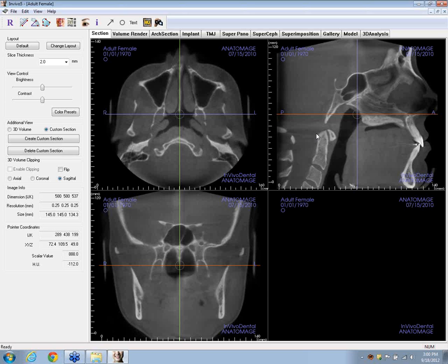Today we're going to talk about reorienting the patient position in a number of situations where it might be useful to you to change things around and change the way that you look at things. Another reason you might use this reorientation capability is if we had an error or misjudged on positioning the patient in the first place.